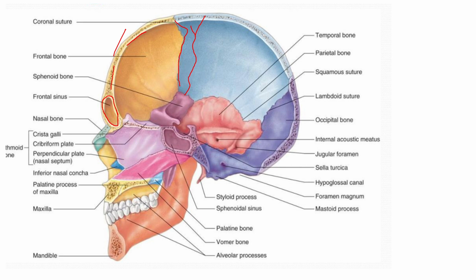Now here you see this triangular bone, which is a part of temporal bone. This is the petrous temporal bone. The internal acoustic meatus, you expect to see the external acoustic meatus superimposing in the center of this bone. Now here see the anterior clinoid process, the posterior clinoid process.